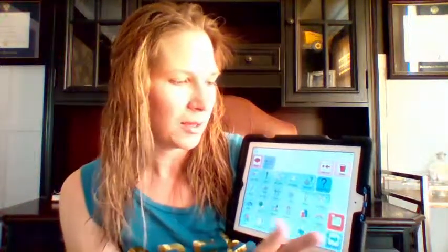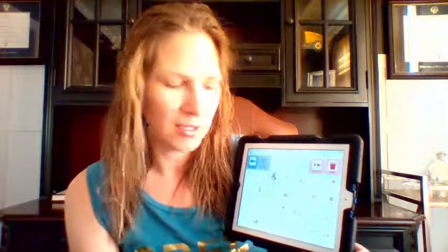So the ABC words, the only thing I wish is that, and it is organized by 2 pages, I wish that it was alphabetical throughout the 2 pages. So if only H fit on the first page and then go from there to Z on the second page, I think it would be a little bit easier to understand versus having to go A through Z on the first page and then going to the second page to go A through Z again if you didn't find it on the first page.